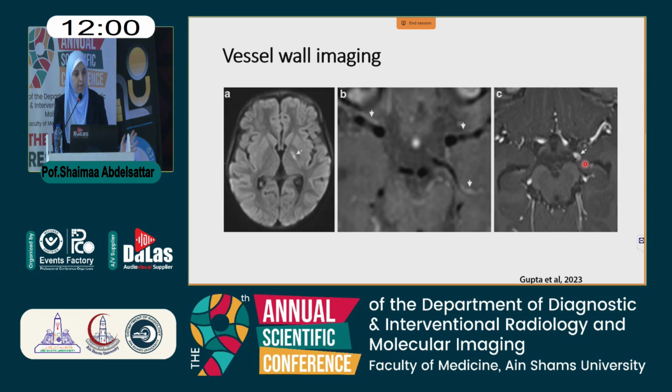Also, on MR vessel wall imaging, we can see here infarction in the left internal capsule. We can see here enhancement of the vessel wall on the MR post-contrast vessel wall imaging.